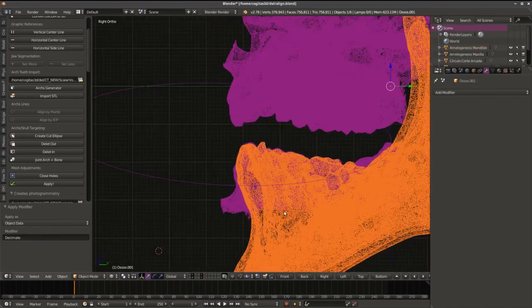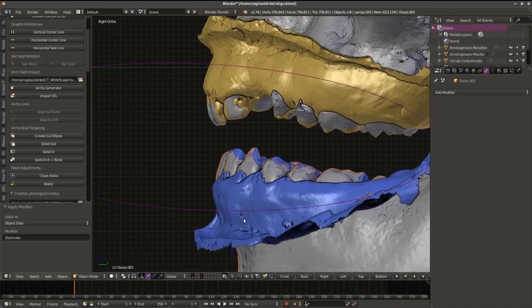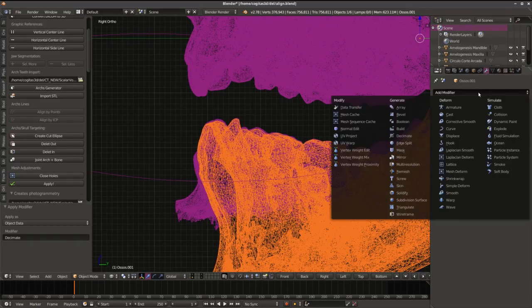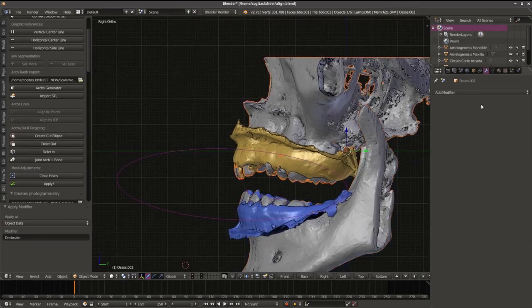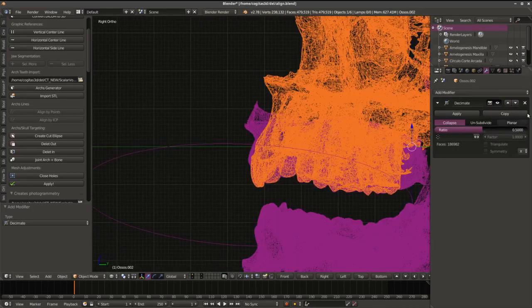and like we already decreased the value of the bottom mesh, I will decrease the value here too. I will put the decimate here, half of the value. Okay, it's good. It keeps the structure, apply, and I will do the same thing in the upper object, the decimate 0.5. Wait a little until it finishes. It is already done, and I will apply.